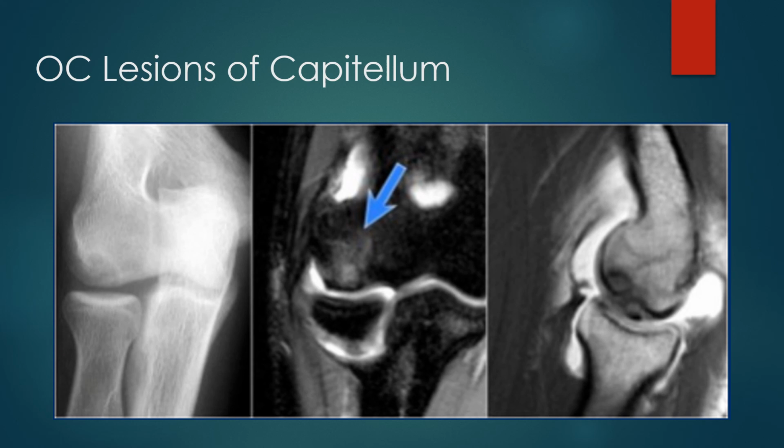We can still see that black tracing of the subchondral bone abnormality I mentioned, but it looks like a pretty stable fragment without any loose bodies. However, when we look at the joint itself, there's some cartilage thinning, but again, there is no lesion that dips into the joint line. So this gymnast probably underwent non-operative management for several weeks to allow everything to heal, and then progressed back to gymnastics as symptoms tolerated.